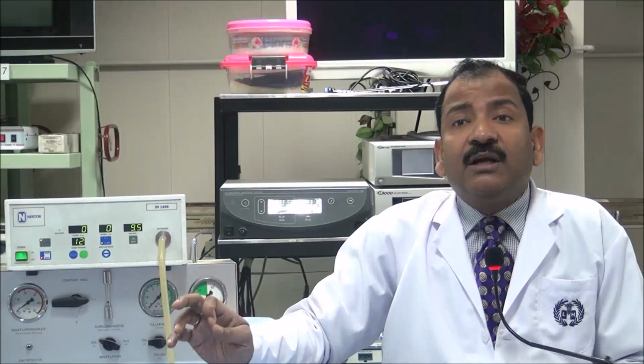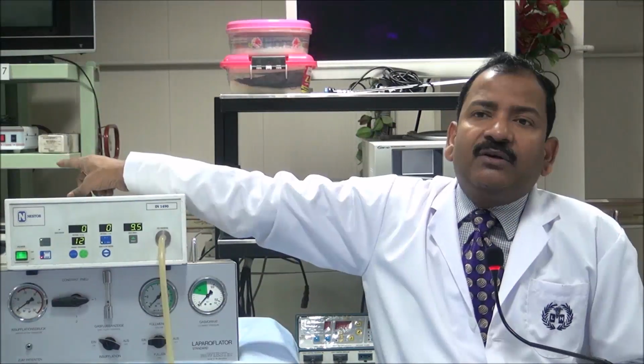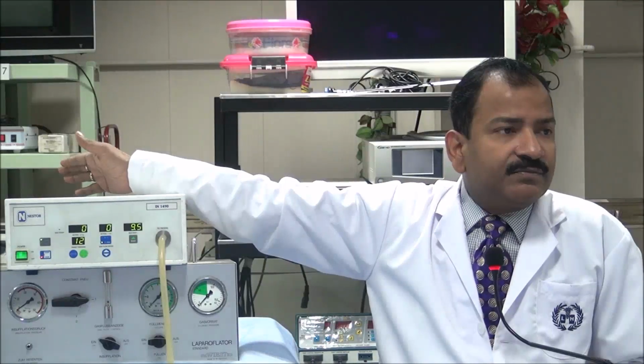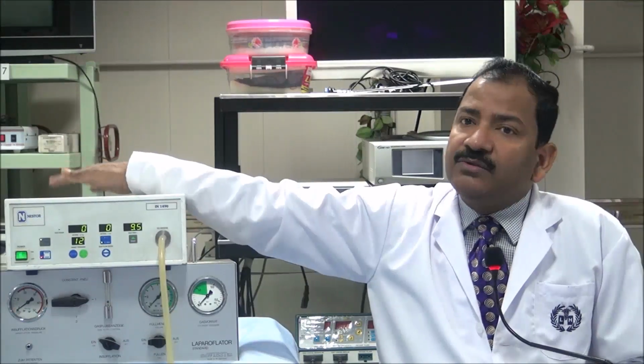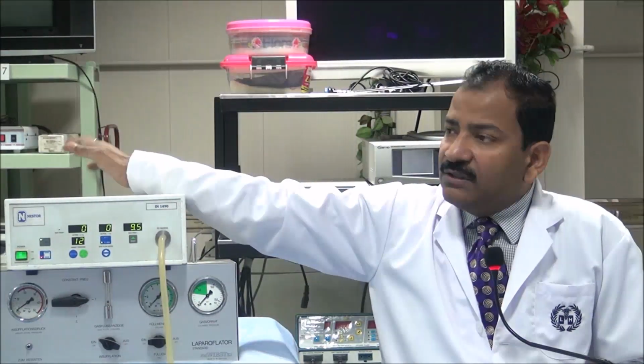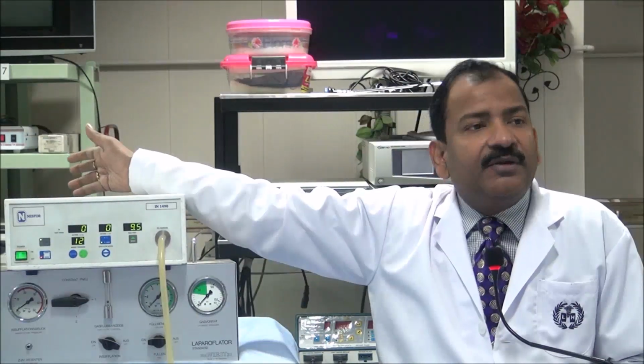If you get industrial CO2 in this cylinder, it will cost you only 50 rupees. But if you get medical grade CO2, it will cost you 300 to 400 rupees to get it filled. Of course anybody wants profit. So they will tell you that it is medical grade, but to get a good profit, they give you industrial CO2.